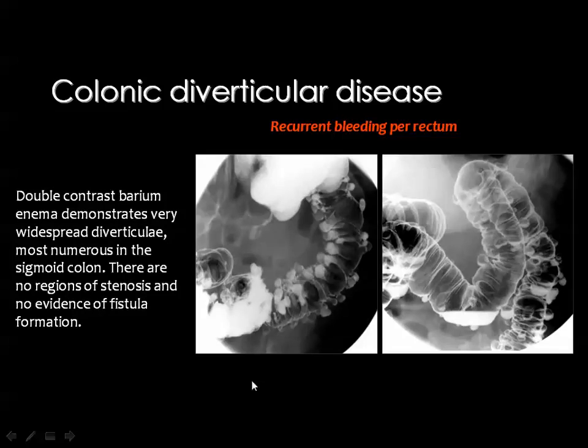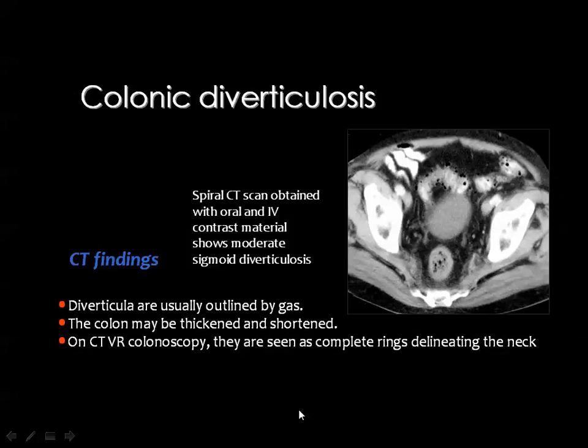This is also a good example of diverticular disease of the colon affecting the left side. Most of the diverticuli are filled with barium, and some of them contain air. This is uncomplicated diverticular disease of the colon.